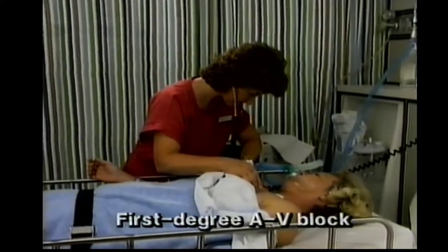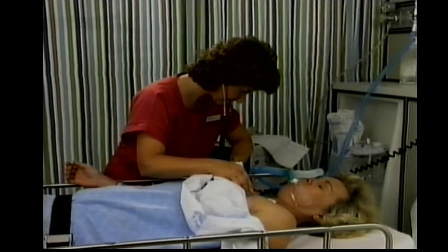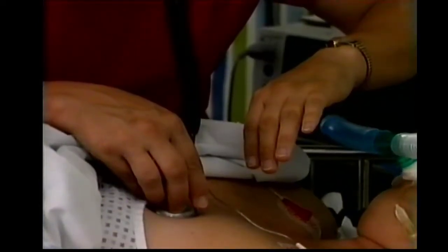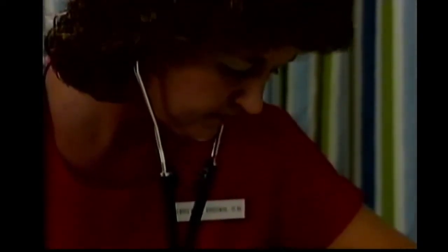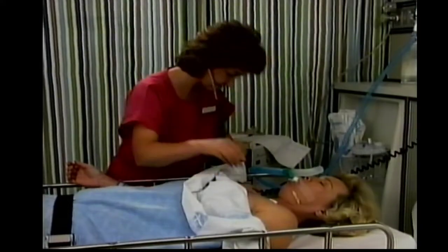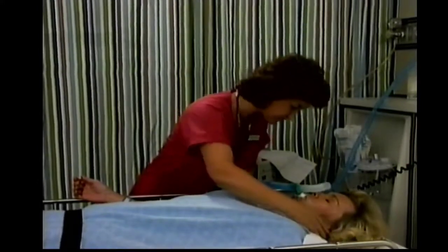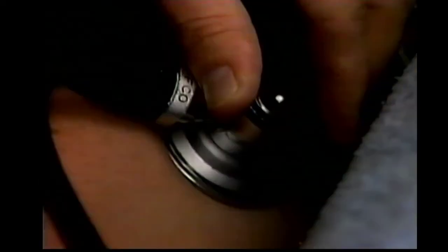These findings indicate a first-degree AV block. This occurs because electrical conduction through the AV node is delayed, which is indicated by PR intervals of greater than 0.20 second. First-degree AV block can develop in people with healthy hearts, or in people whose hearts have been damaged by ischemia, infection, rheumatic fever, or drugs. This dysrhythmia probably resulted from the anesthesia administered during surgery. No doubt it will resolve spontaneously as the anesthesia effects wear off.